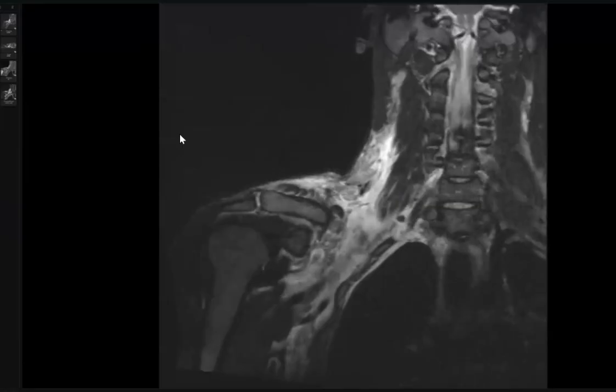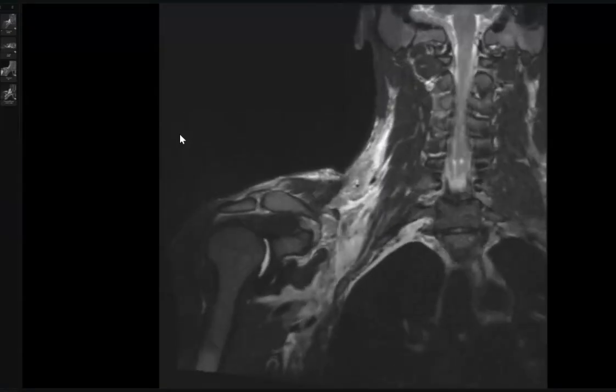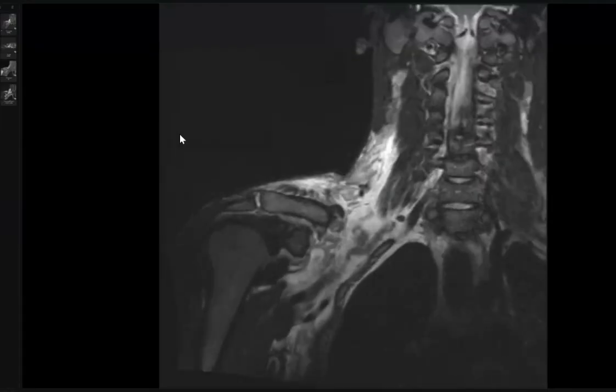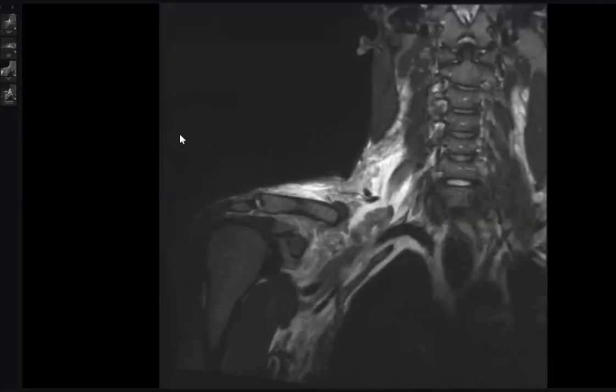Post-traumatic what? Nerve injury. Which nerve injury? Nerves of the brachial plexus, which supply the muscle. Could you show me which nerve? I'm scrolling for you. Stop me. Yes, this thin one. So this one, it will be suprascapular. Sir, I don't remember exactly. So what's your diagnosis?